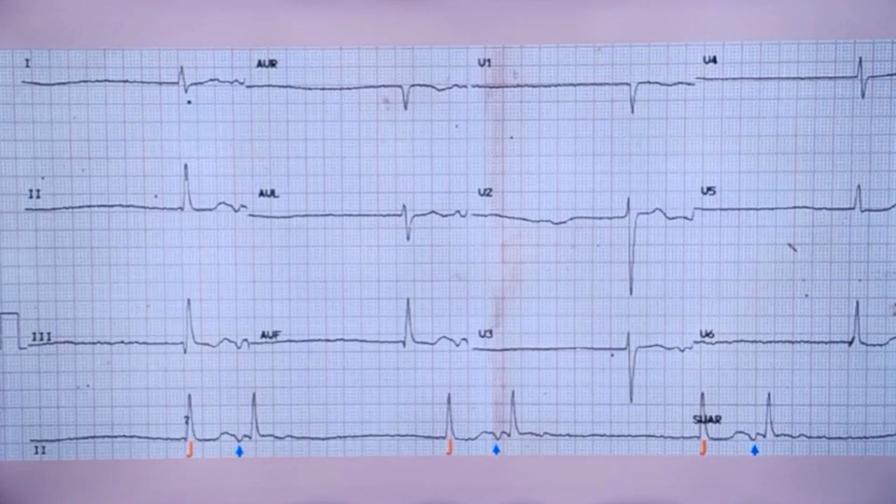Now I am going to discuss a somewhat rare form of arrhythmia, escape echo bigeminy. There are various types of bigeminies, and we'll have a short discussion about the other types of bigeminies after the initial ECG discussion. One look at this ECG tells you that there is severe bradycardia. Now we'll see what is the cause of bradycardia.